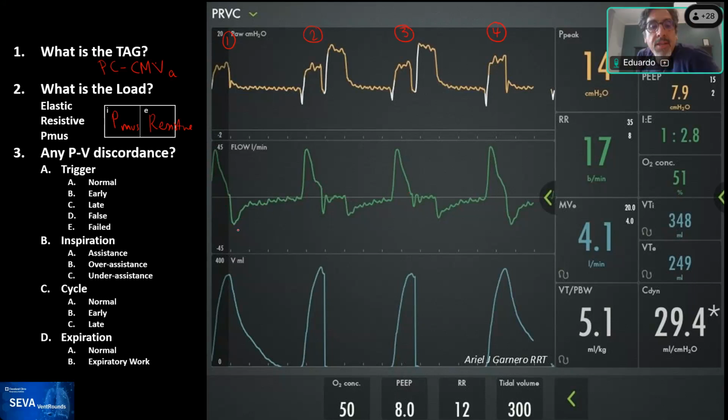And a trick here that may help you guys is to remember that sometimes the flow waveform doesn't show everything, or the scale is not as pretty as you want, and you always have the amplification that occurs in the volume waveform, and that may help you see a little beyond, or to characterize how the decay looks during that period of time.